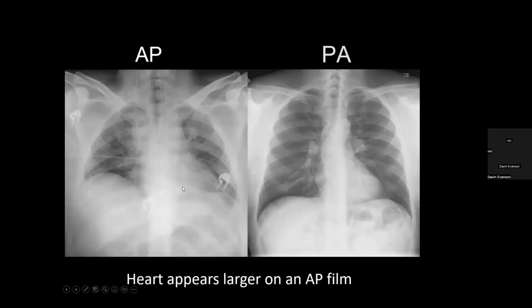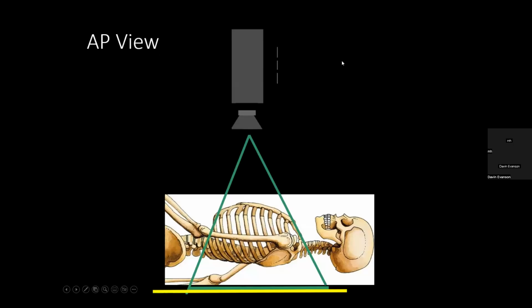Why is this important? Well, the heart will appear larger on the AP film. The heart is an anterior structure. And when you do the PA radiograph, the heart is right against the cassette, so there's less magnification, whereas with the AP, it's further away, so you have inherent magnification. So anytime we can do a PA radiograph, that's one of the reasons we like to do it.